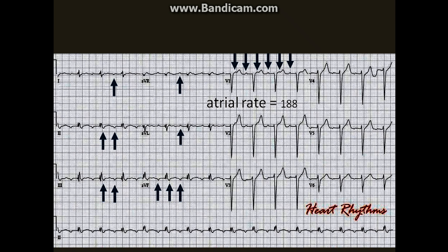Previous classifications of atrial tachycardia have been based exclusively on routine EKG with a constant rate and an isoelectric baseline between 2 consecutive P waves. Atrial flutter is typically a reentrant arrhythmia defined as having a pattern of regular tachycardia with a rate above 240 beats per minute without an isoelectric baseline between deflections. The typical atrial flutter, or the cavotricuspid isthmus dependent atrial flutter, usually shows a sawtooth pattern in inferior leads.